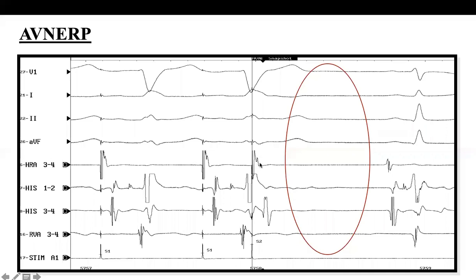Again, it's the atrial tissue. So all of these are atrial tissue. The atrial contraction has been recorded in the high right atrium first, followed by the His area. So we know from this that the paced chamber was the right atrium, not anything else.